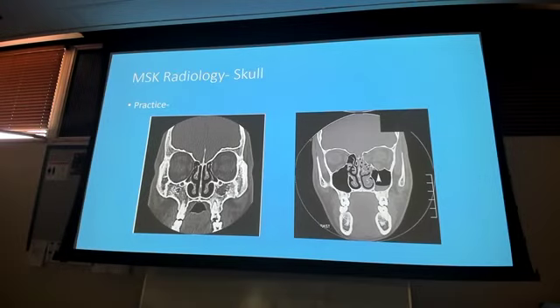Now your fracture classifications. Alright, here's a practice one to kind of take a look at. Again, I got air fluid levels in my maxillary sinus. Can't see it on this slice dripping down here from the orbit. Can't really see that, but I do see this level of fluid that's not in the other one. So that's probably blood, and then look at my ethmoids compared the two together. Right? It's all about comparison.